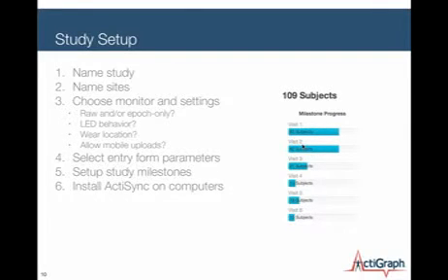Then we work with you to get ActiSync installed on the computers in the field. ActiSync is not like ActiLife. It's a very lightweight application that is simple to install. It installs in just a few seconds.